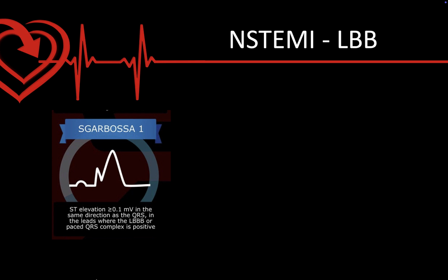The specific details of this are beyond the scope of this short video, but a quick overview is that Sgarbossa 1 says that if you find ST elevation of greater than 0.1 millivolt, in other words, greater than 1 box, in the same direction as the QRS, in the leads where the left bundle branch block is positive, in other words, where you have a big QRS complex with positive deflection, there is also ST elevation in the same direction. That is a significant finding and likely indicative of an MI.